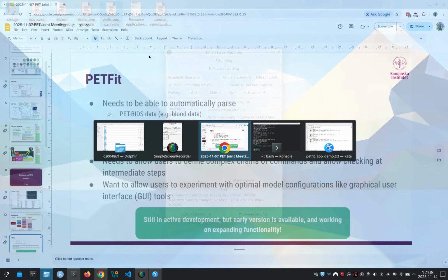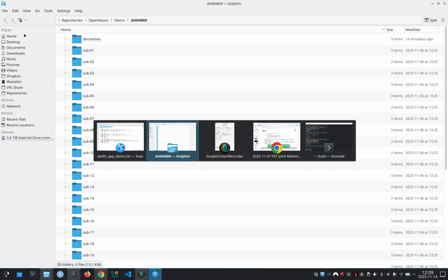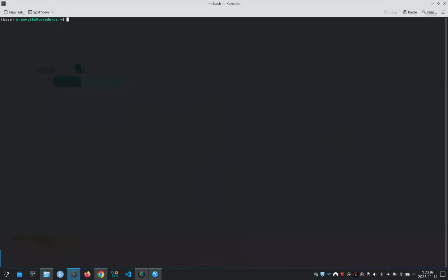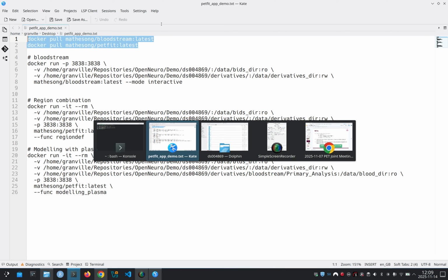So what we will do is I've provided some tools over here. Here we can Docker pull. These are the latest versions of the BIDS apps. If we Docker pull each of these, this is basically how we download them, and then they run within their containerized application.